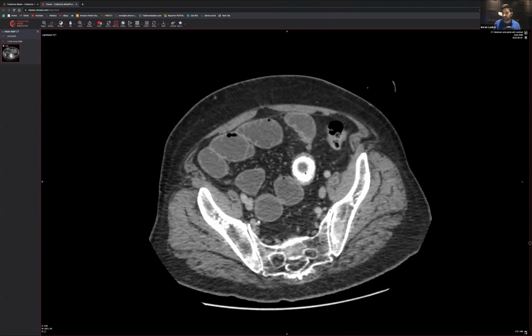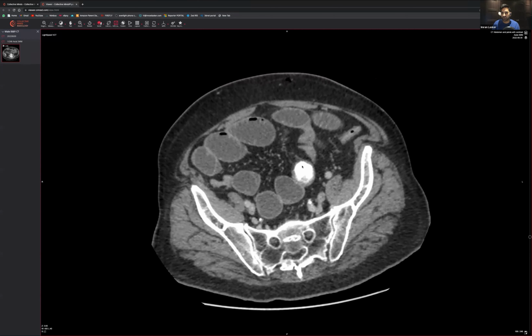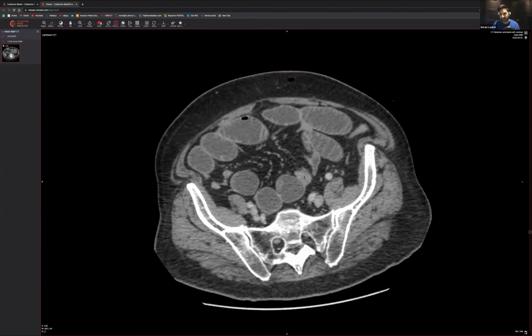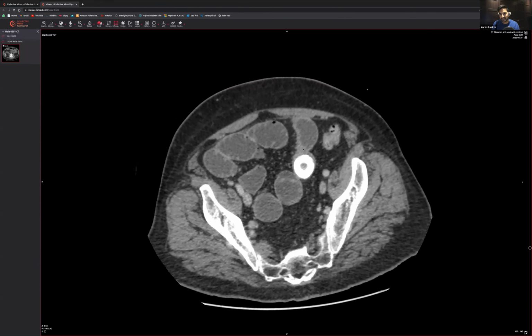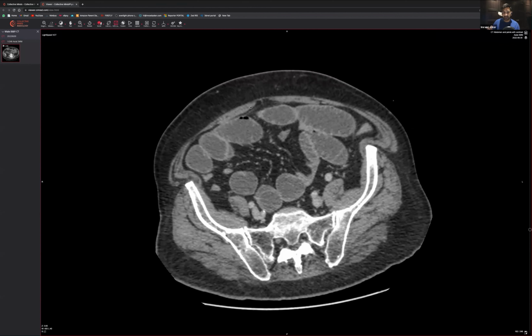It's exactly what gallstones look like on CT. If anyone hasn't seen it before, gallstones look very lamellated, like layers, lots of layers. When they slip through into the bowel like that, it can result in this sort of gallstone ileus, this sort of obstruction-looking appearance. The other thing you can try to do is follow the bowel. You can see the bowel coming out this way looks quite collapsed. But if we go the other way, you can see from that point upwards it's very, very dilated. So that's another way to look for transition points, from normal bowel to abnormal bowel.